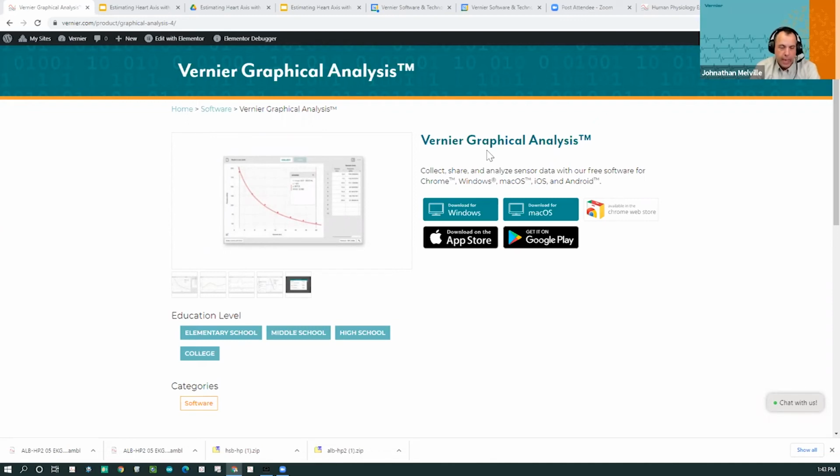Like I could actually start up GA Pro, put on the electrodes, have you all connect to a session, and the data would come across while I'm recording it. The other really nice thing is once the data has been exported, it's in their format, right? If any of you logged on and got that data, I still have it on my Chromebook. Let me show you here.